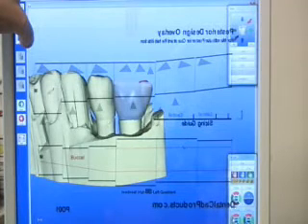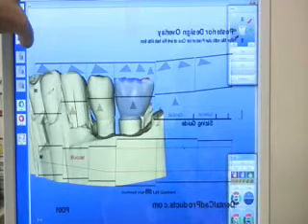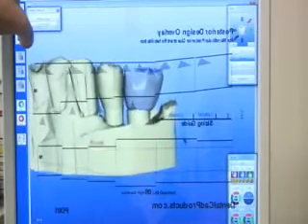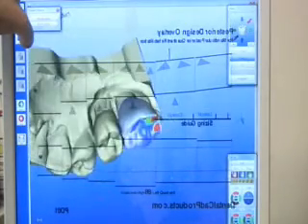Through the use of the scale tool, position, rotate, we move the proposal into a position where we want it. You can see how if you bring it up to the top line of the buccal view to posterior overlay, it helps establish the curve of Spee. The three triangles give us indications of where we want our cusp tips to be, and also how we want our marginal ridges, cusp marginal ridges, to be.